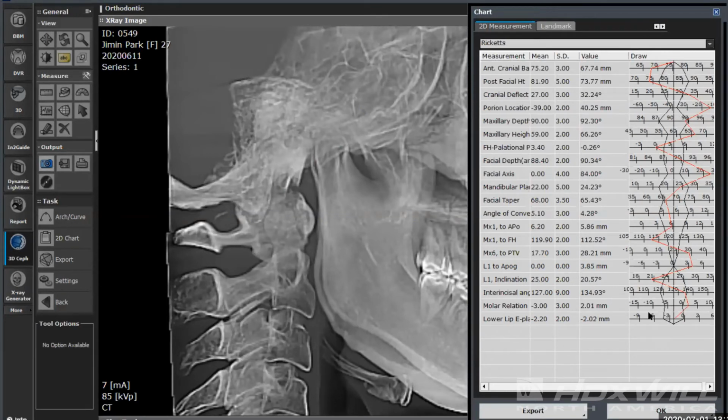Once you pick out your points, you can walk through these and get that 2D analysis. Again, export that analysis for your own benefit and your treatment plan. But you're able to go through all of that with the analysis, all doing this off of the CBCT. So you don't have to have that Ceph arm if you don't want to, because you can start moving into the realm of being able to do it all through the CBCT as well.